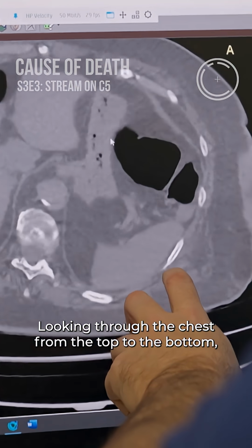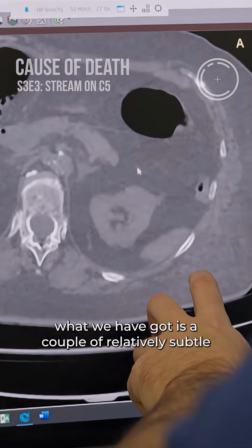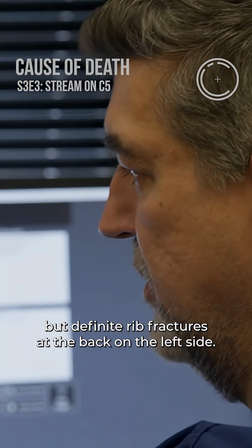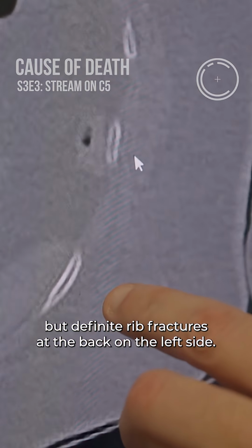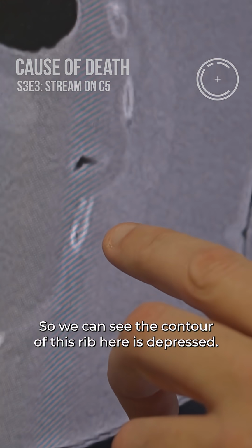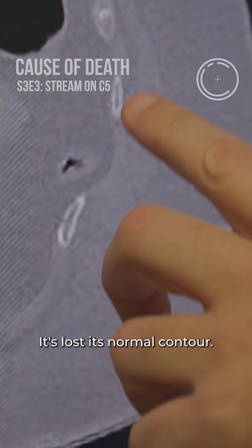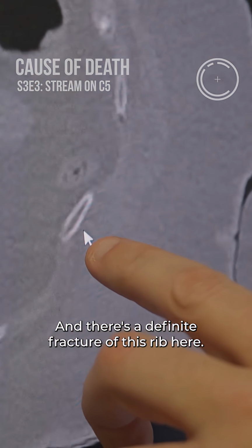Looking through the chest from the top to the bottom, what we have got is a couple of relatively subtle but definite rib fractures at the back on the left side. So we can see the contour of this rib here is depressed, it's lost its normal contour, and there's a definite fracture of this rib here.